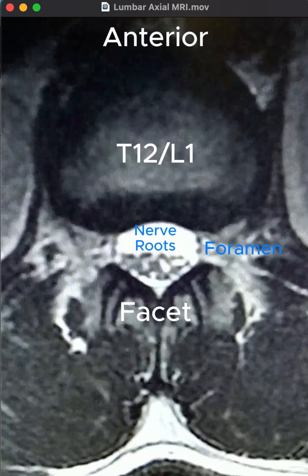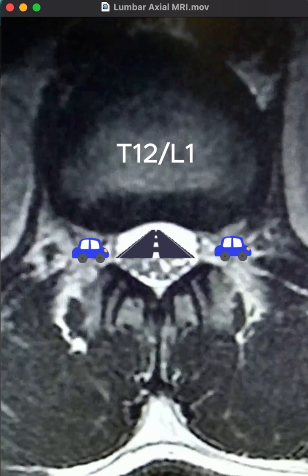Now, the way that I typically view the spinal canal and foramen is it's almost like a highway. So again, you have to picture how you're viewing the patient. They're on their back and you're looking through their feet up until their head. Using this highway analogy, the nerve roots will travel through the highway and then will exit through the foramen, or these exit ramps. So this is the left, this is the right.